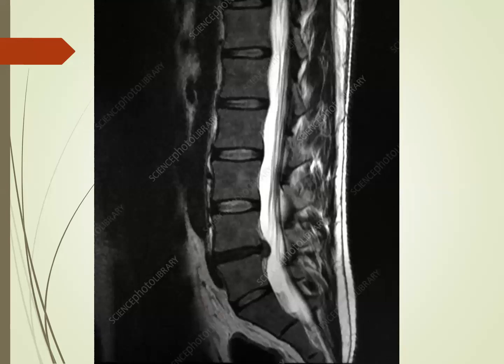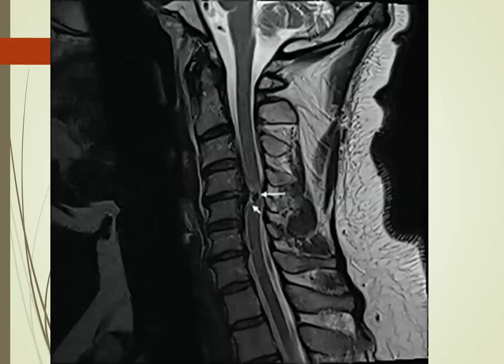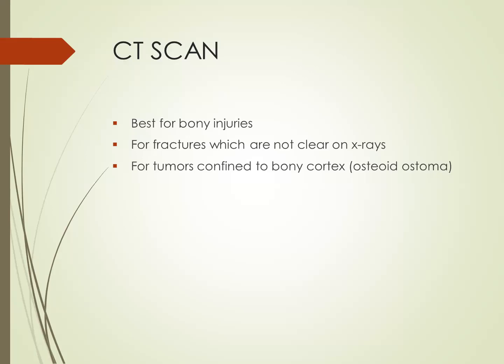This is a particular example of disc affecting the spinal roots. This again is a disc impingement at C5, C6 level. This is how it's identified that the normal spinal cord is moving down and there is impingement at different levels. Again, disc impingement, showing severely affected canal. The role is particularly important to be identified.